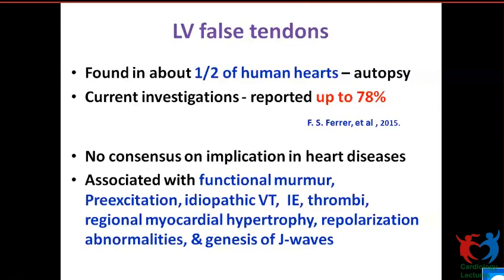okay, so these are false tendons. They should not be mistaken for a thrombus. These are all normal variants which you look for. What are the normal variants in the right atrium you look for? Eustachian valve, ma'am. Okay. Eustachian valve. Where is the Eustachian valve? In the IVC, IVC RA junction, near the fossa ovalis, IAS.